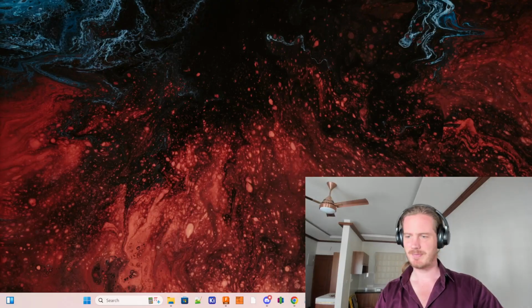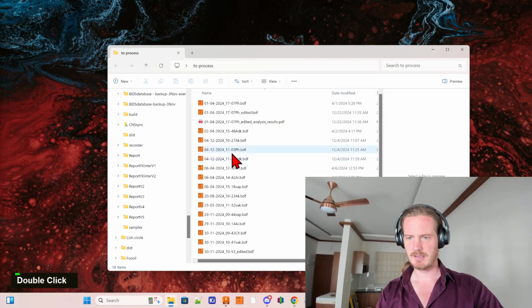All right, so we're going to do a second session of annotating the pre-recorded EEG files, the BDF files. So let's take a look. Open my process folder, and this time I'm going to do this file.